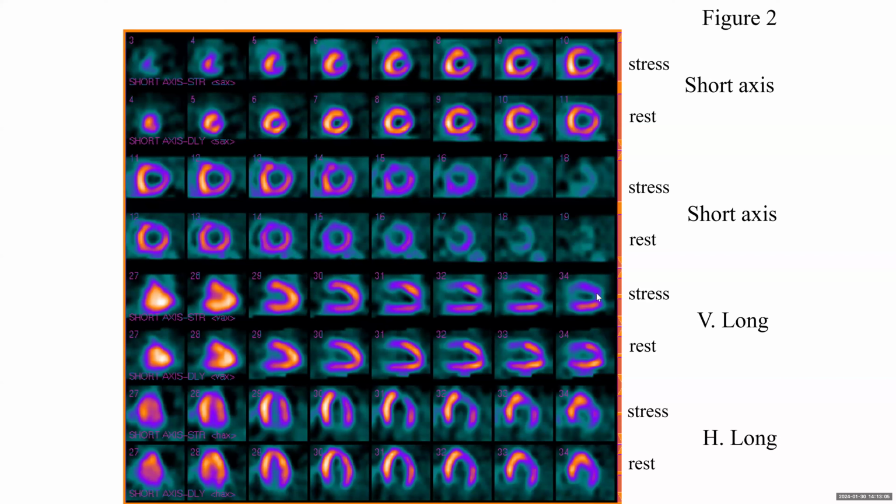And here it tells you anteriorly, which segment you're actually in, the anterior wall. And you can look at the lateral here that it's also affected slightly, but not as much as the anterior. So this is a basal to distal anterolateral perfusion defect consistent with ischemia in what territory?